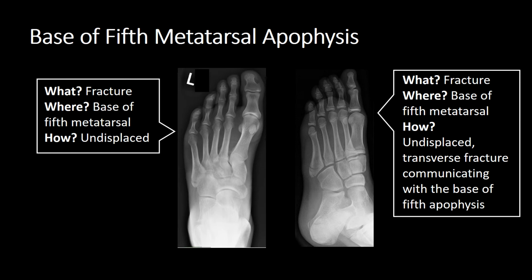On the left, what is it? It's a fracture. Where? Base of fifth metatarsal. How? Undisplaced. On the right, what is it? It's a fracture. Where? Base of fifth metatarsal. How? Undisplaced transverse fracture communicating with the base of fifth apophysis.